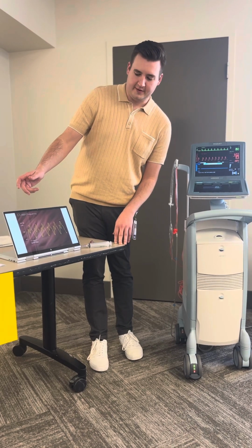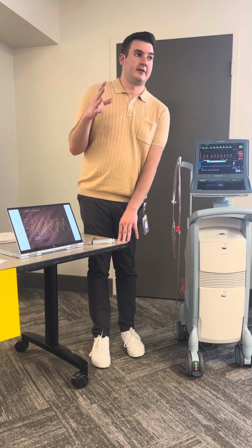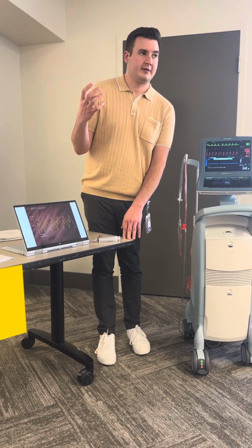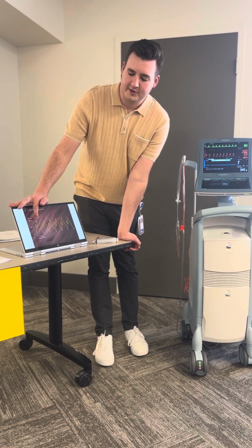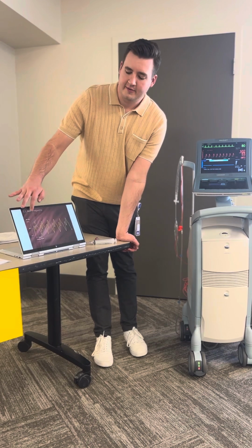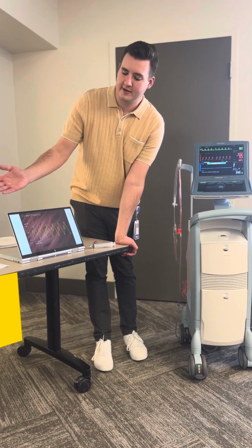So one of those is going to be the augmentation. And you see these peaks right there? The tall ones? That's when the balloon is inflated. These little peaks just before that, that's the patient's systole. That's them, their heart contracting. That's the left ventricle contracting. The reason that this top one is much higher is because when there's more blood inside, here when it's inflated, there's an increase in pressure. So this is called the augmentation. It's always going to be higher than the patient's true systole because there's an increase in pressure, increase in blood.